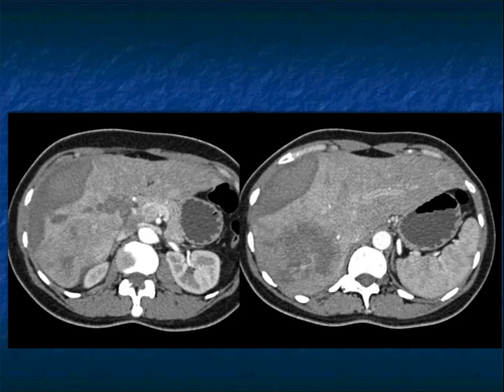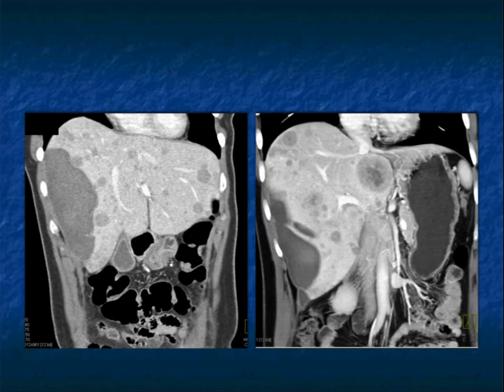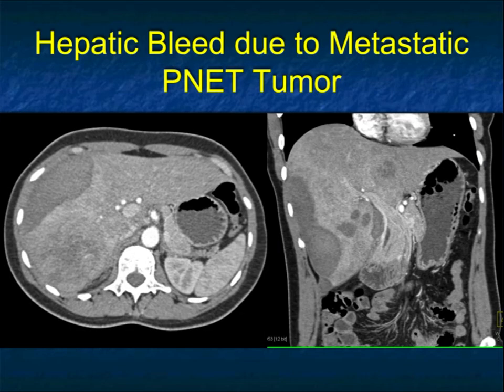Sometimes I will see it, other times, like in this case, really hard to predict. You can see on the venous phase, the lesions wash out, the dominant mass right lobe, multiple additional small masses in right and left lobe, consistent with multiple hepatic adenomas. Okay, just a very nice example.